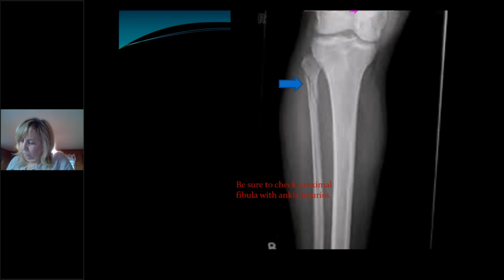So you can also get proximal fibular fractures, and this actually occurred. This is one that I missed. Here's my dirty laundry. This kid came in, had a significant lateral malleolus fracture, a lot of pain in the ankle, rolled it, and had a high torque injury. And I took care of his ankle. Life was good. And he kept complaining of knee pain, and we got the x-ray a little later and I realized, oh, stupid me. I missed something here. It doesn't change his outlook, but I should have recognized it.